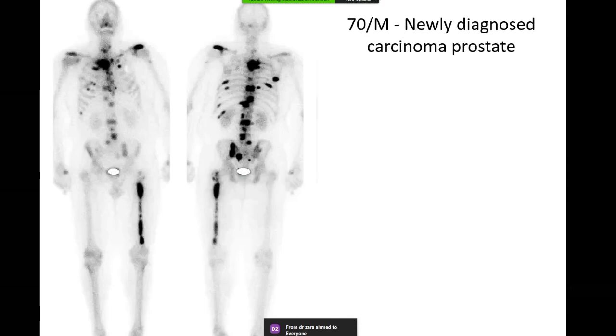Now, certainly, if we have a very large osteolytic lesion, it may occur as a photon deficient, or what we call a cold area. So in some scenarios that could be true, but a lot of the smaller osteolytic lesions can give rise to very intense osteoblastic repair, and that can lead to increased uptake on the bone scan.